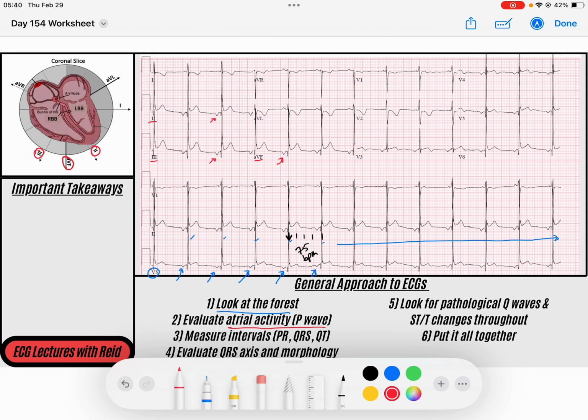You would likely be spreading from low to high, especially in the case of a P wave that comes before the QRS, with an ectopic rhythm, right, where there's some ectopic focus that fires off and spreads throughout the atria from low to high. And that creates negative forces as those forces are going away from leads 2, 3, and AVF. So we've got something that is an ectopic atrial rhythm. So that's our first finding.